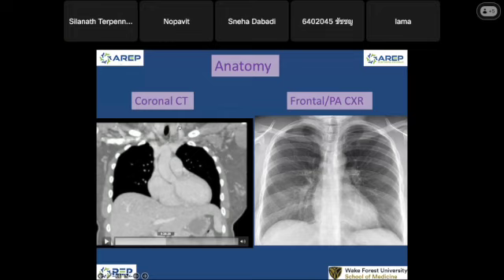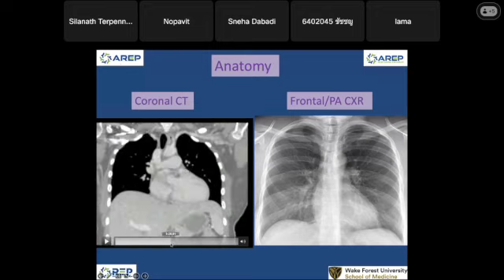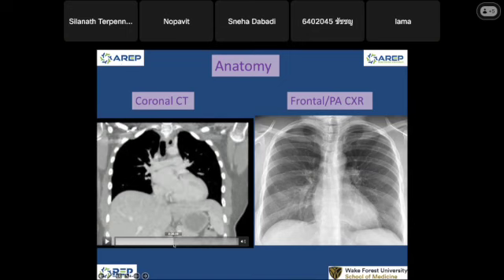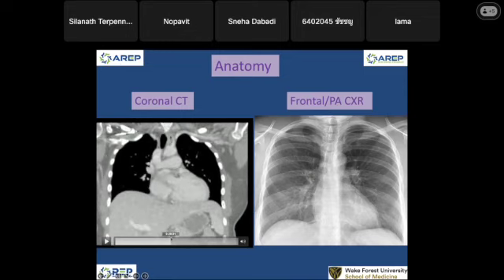Normally, the function of the thyroid gland is trapping iodine from food or from anything that's coming into the body. So this contrast media is iodinated contrast, and the thyroid gland will trap a lot of that contrast. So this is the left common carotid, which is the second branch from the aortic arch. And the last branch of the aortic arch is the left subclavian, this one. Okay, and you'll see that it's curved a little bit, becomes the left subclavian artery and goes into the upper extremity.